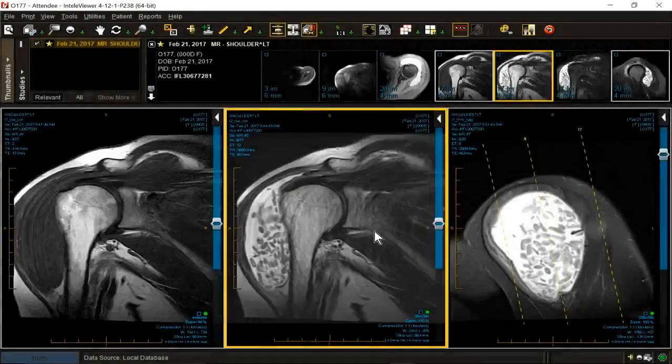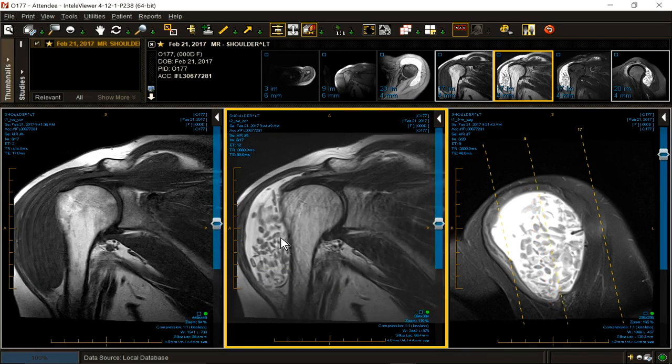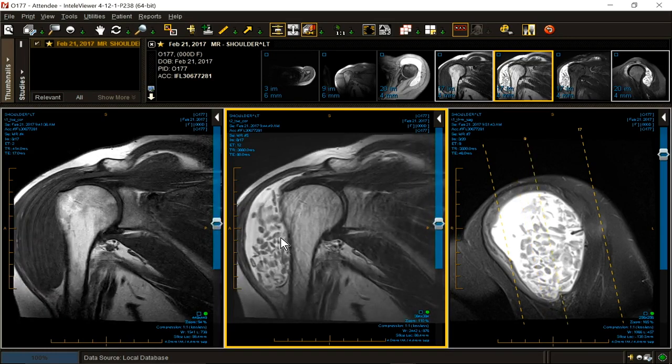So we have to move in another direction. What might that direction be? How about synovial metaplasia, like primary synovial chondromatosis? Is that the right shape for a chondromata? Yes. Is that the right signal for a chondromata? For multiple chondromata? Yes. That would be a high choice.